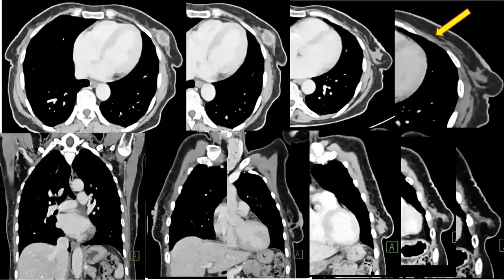And this is her CT chest, also a second miss. If you look here, this is the lesion, and these are ductal extensions. Look at the ductal extensions in the two directions, and look at the satellite lesions here along those ductal extensions, approximating the chest wall.